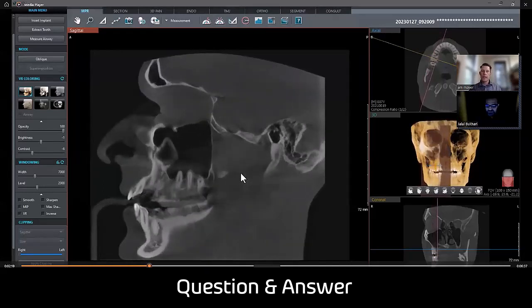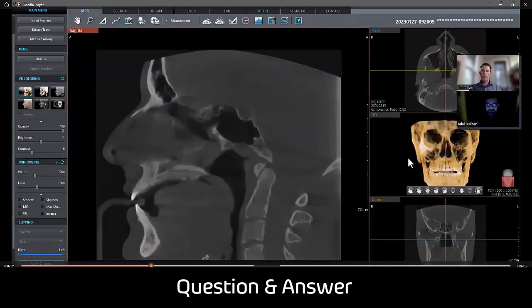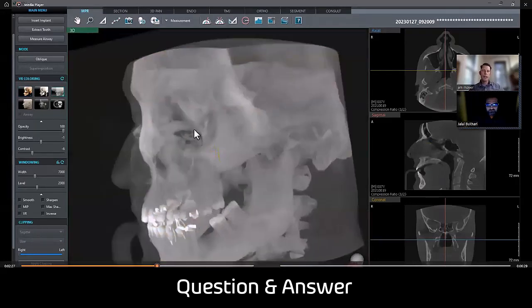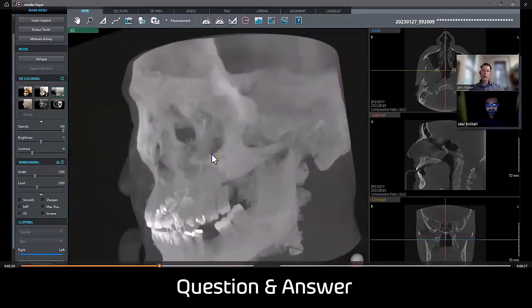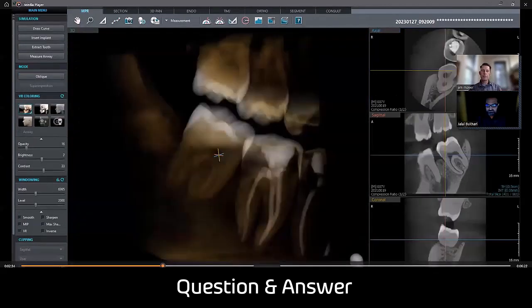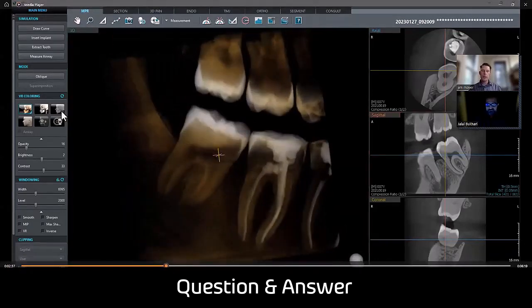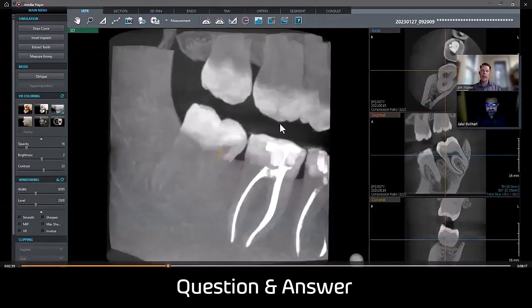And then another question that came up was where we can look at our 3D volume here. One of the questions was looking at the smaller 4x4 image, because right here I have a lot of anatomy and basically the entire skull to review. But now we've switched to that smaller 4x4 image, and here we have the 3D volume. But when we go lateral medial across there, the next question is, how do I orientate that?